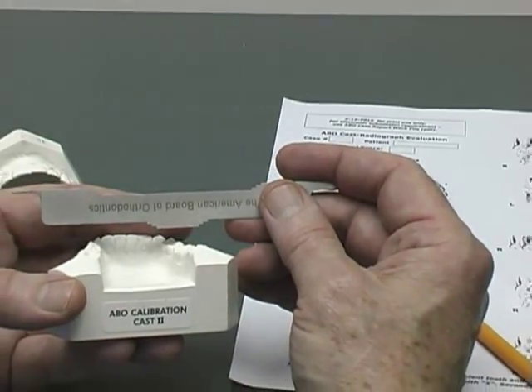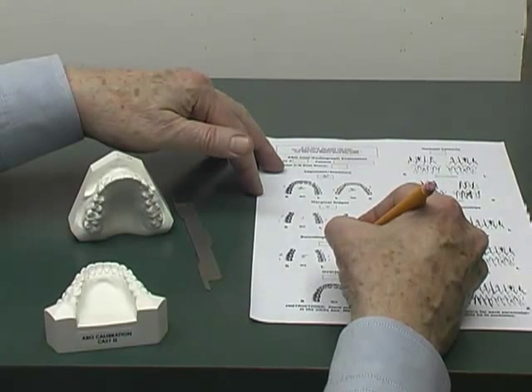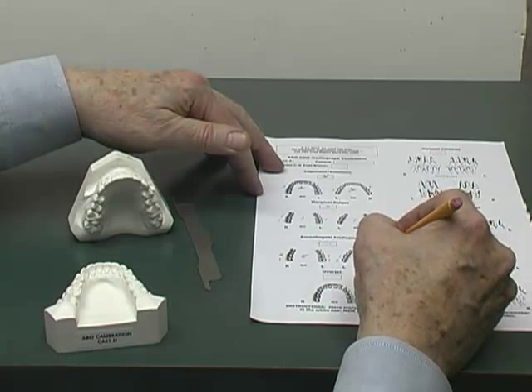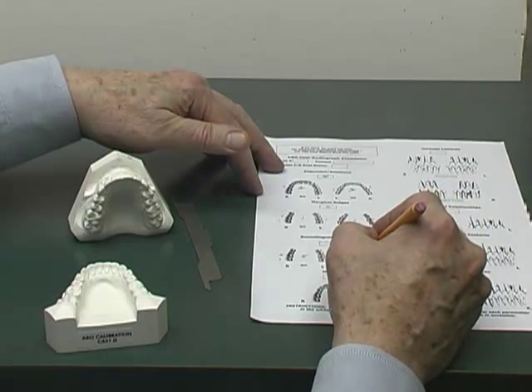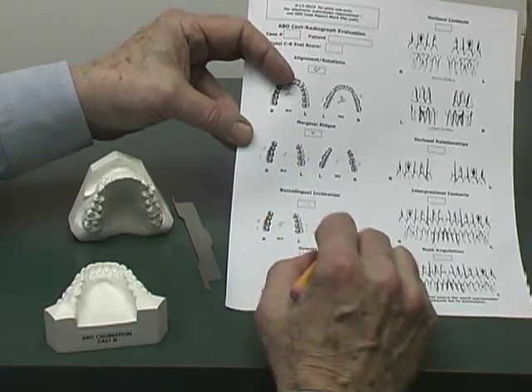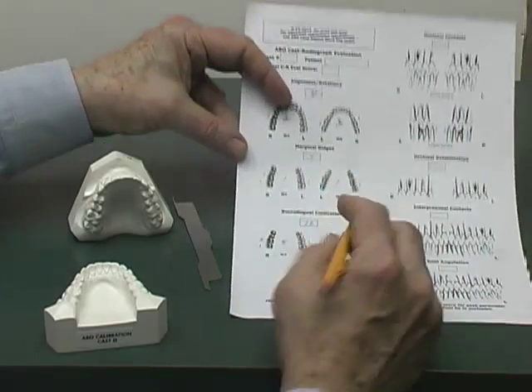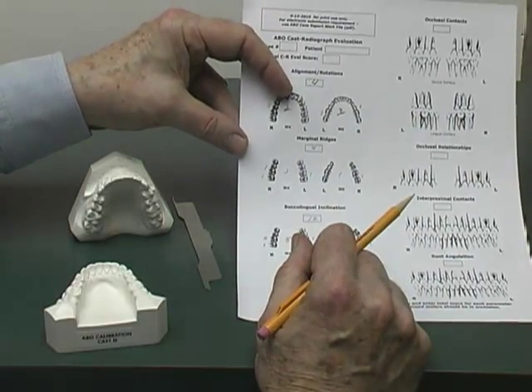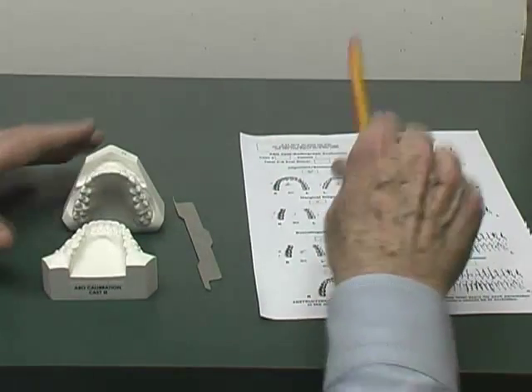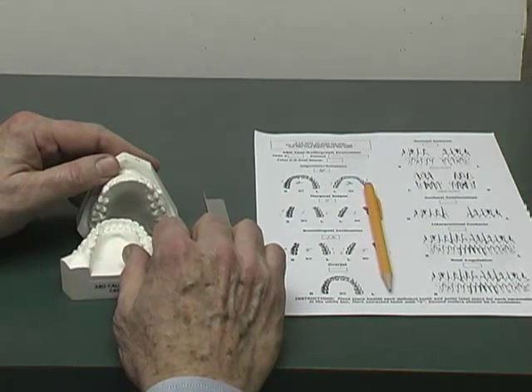So the total score for the mandibular cast is lower right first molar 1, the second is 2, 1 on both sides, and the lower left, and then the lower right's 1 on each side. So that's a total of 5 also. So both the maxillary and mandibular casts measure 5. That totals 10, which is a fairly high score for this particular case. So that's scoring of the buccal lingual inclination. The next parameter we'll move to will be the measurement of the overjet.